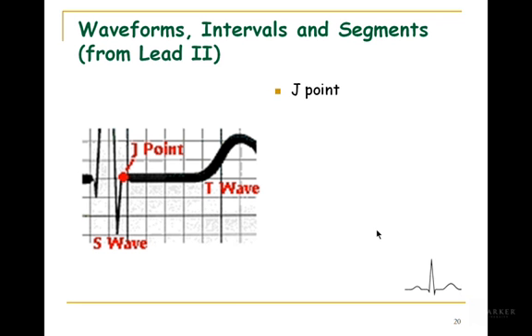There's no current flowing, it's zero potential, it's always zero potential. The ventricles are completely depolarized. We have not started to repolarize, so there'll be absolutely no current flowing at any point in time. No matter what's going on in the heart, this is always zero potential. I don't care where this is on an ECG. The end of the QRS complex at the J point is zero potential.